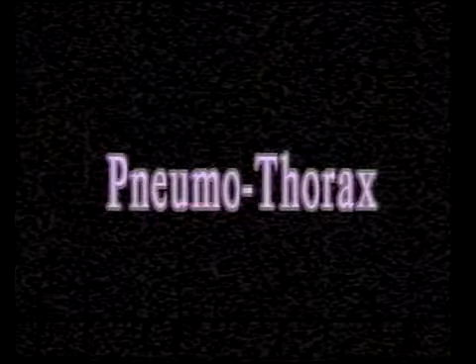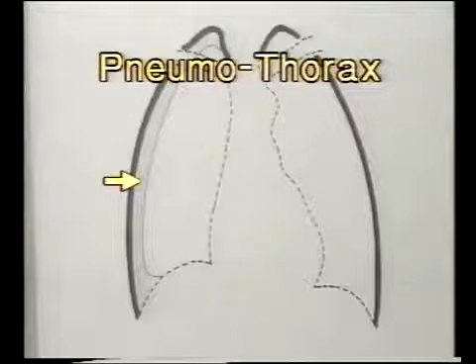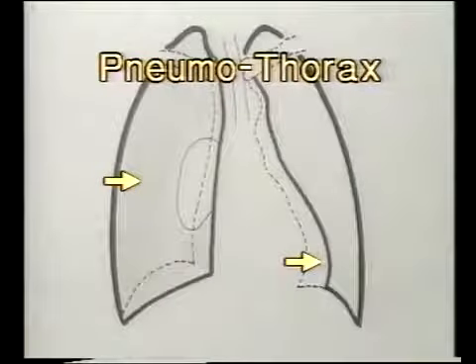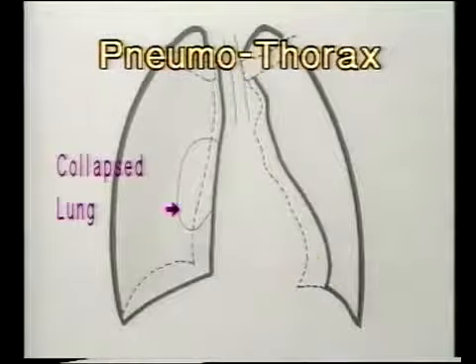Pneumothorax. Pneumothorax is a collection of air in the pleural cavity. It produces a partial collapse of the lung and is seen as a uniformly black peripheral shadow outside the lung border with absence of vascular markings. When large, it produces a complete collapse of the lung and shift of mediastinum to the opposite side. Note the collapsed right lung, which gets collected as a radio-opaque shadow at the hilum in massive pneumothorax.